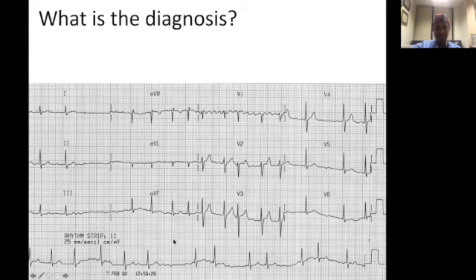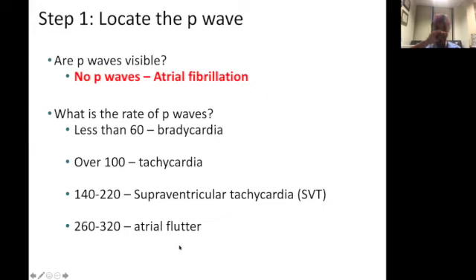Okay, I agree with you. Yes. Okay, so the QRS is irregular. It's not coming at an appropriate time. Yes. And then you also don't have clear P waves before the QRS. You just have squiggly lines kind of all over. Okay, so that's the abnormality that we see. When you see that, that diagnosis is called atrial fibrillation.